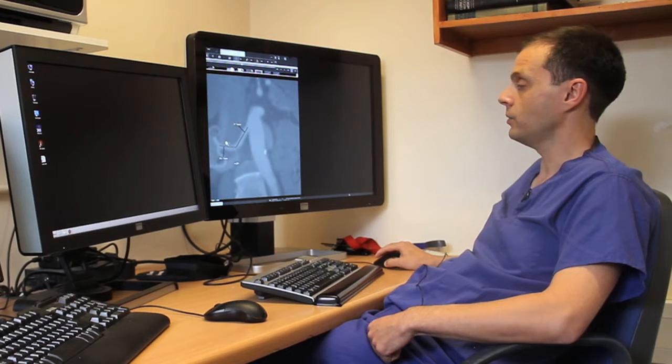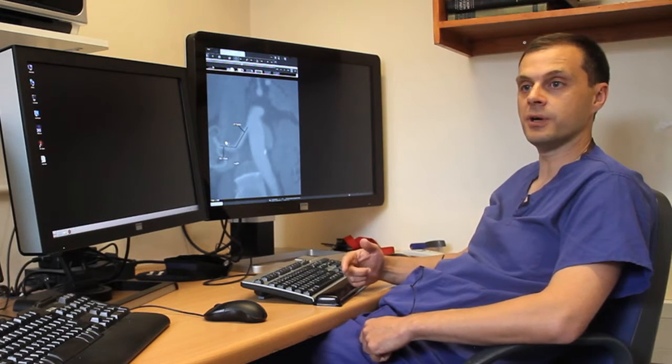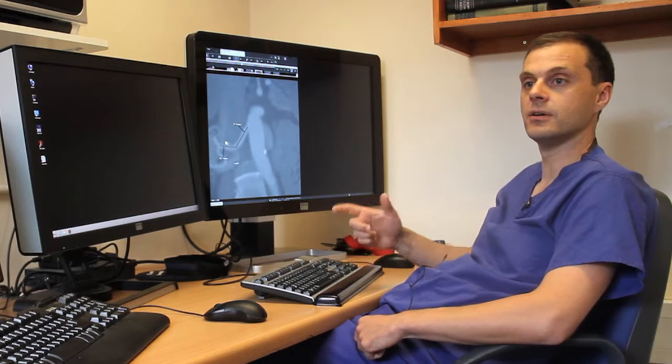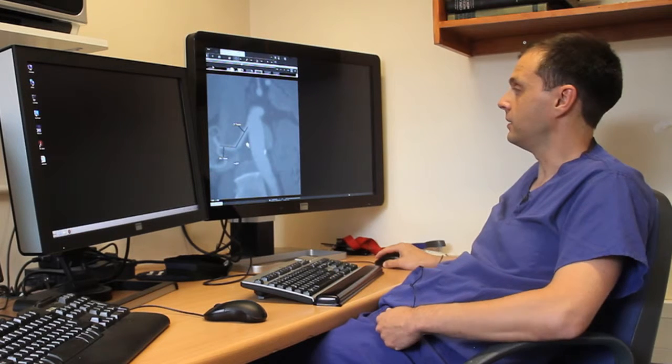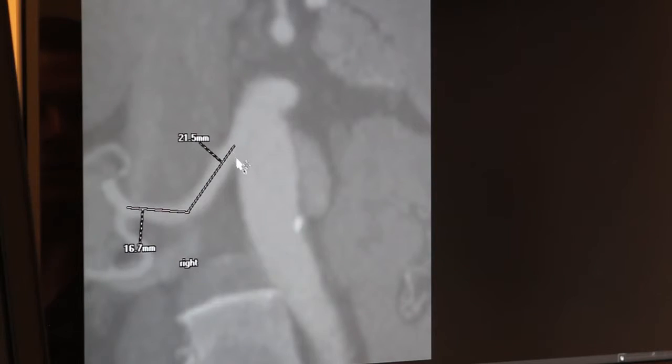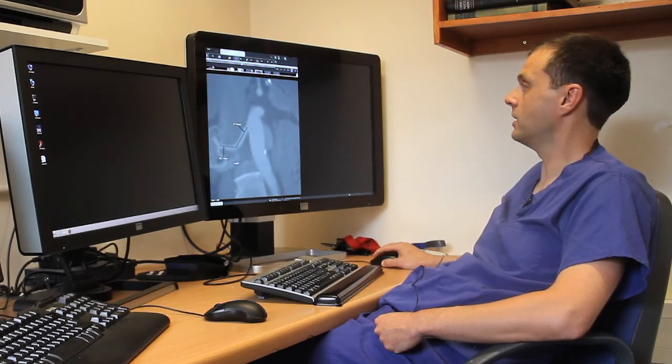the artery. We need to do 5 burns in a helix, 5 millimeters apart, and therefore we need an artery that's at least 2.5 centimeters from ostium to the first division. And in this case you can see that's the renal ostium, that's where the artery divides, and it measures 37 millimeters, which is fine.